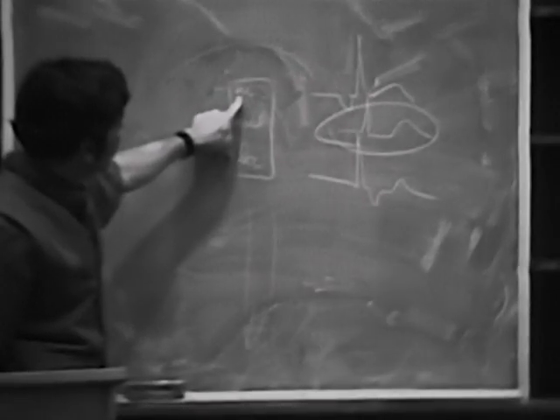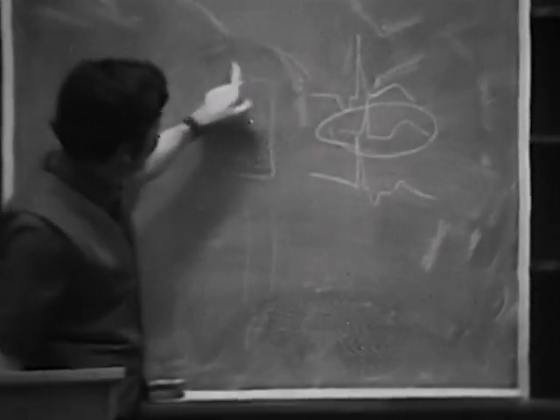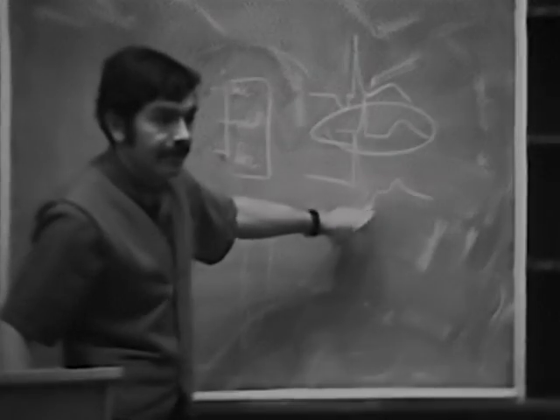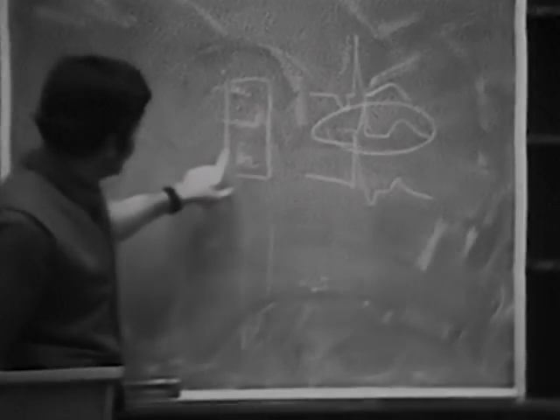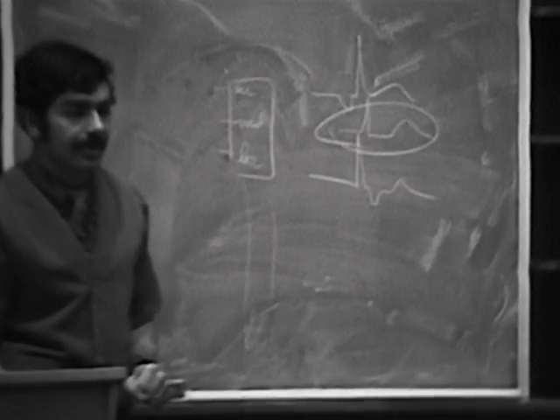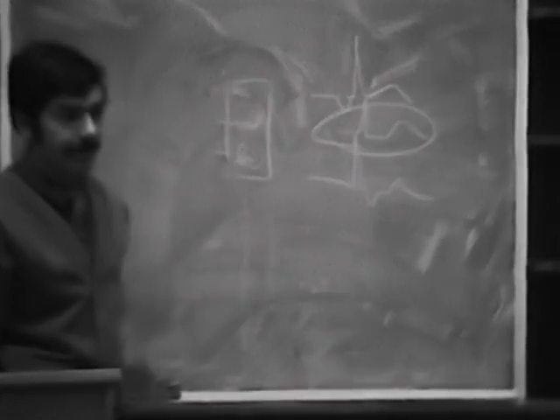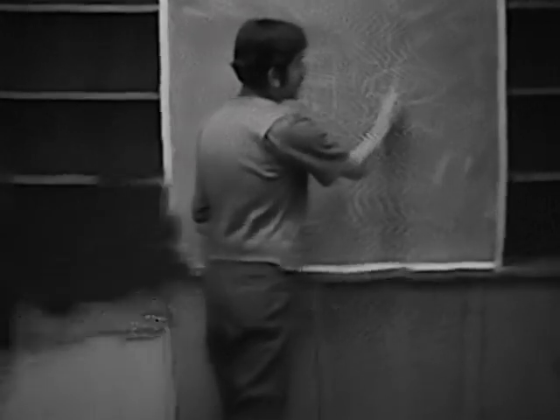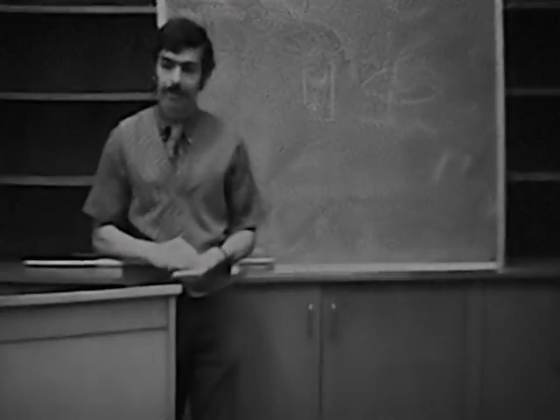Well, high node would be just a small amount of block. Low node would be some more block, right? Because it's coming later. Whereas mid-node, where we don't even see a P wave at all, is probably due to what? It's probably complete block. That's why we don't see the P wave. See? So I think that's a better explanation than to say that that P wave is lost in the QRS, though that could be what's happening in some cases.